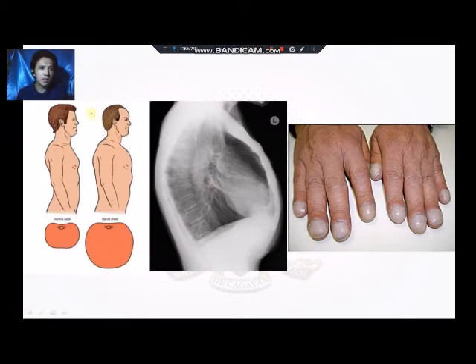This is the barrel chest deformity. Medyo ang anterior and posterior diameter sa atong patient is nag-increase na siya. The normal chest, in comparison with a barrel chest deformity, almost lingin na kayang thoracic nga area compared to an oval shape.